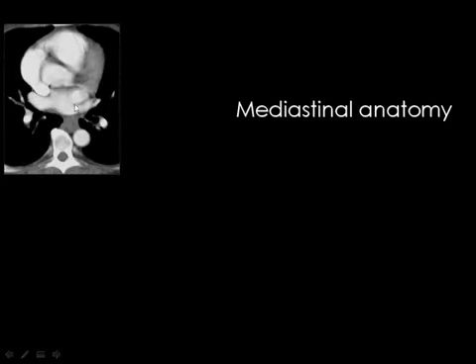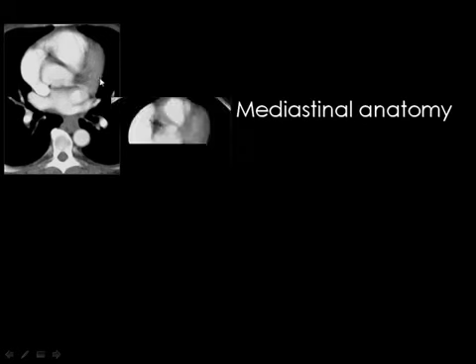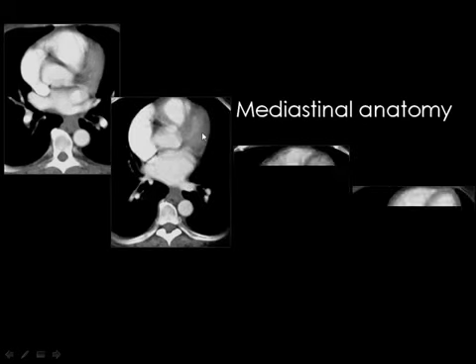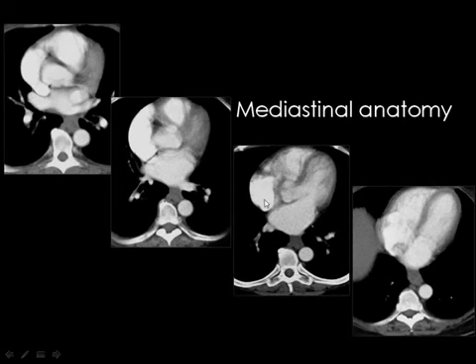Come to the same anatomy: left atrium, right ventricle, left ventricle. Go down, left atrium, right ventricle, left ventricle. More down, the same structures.